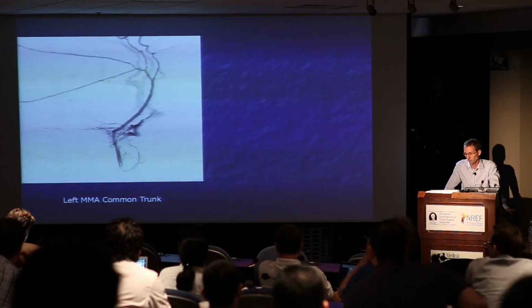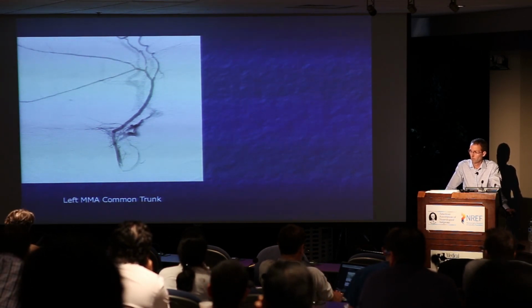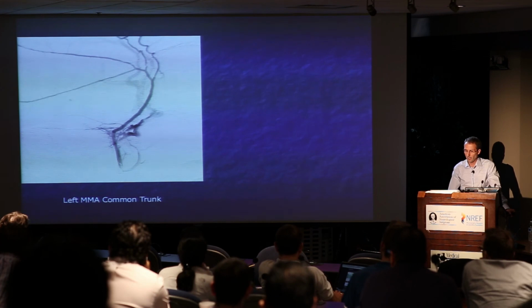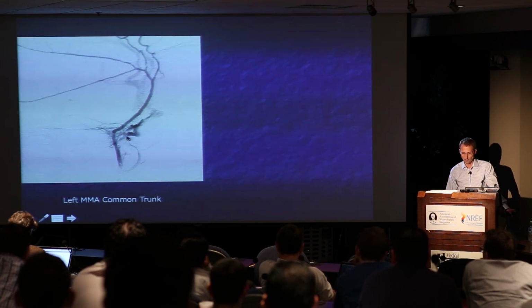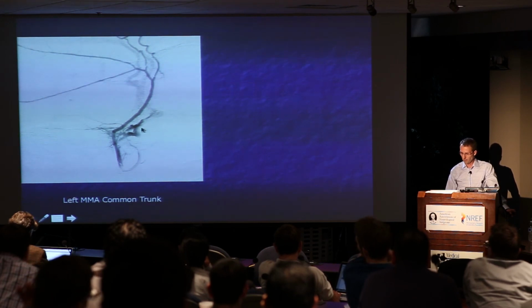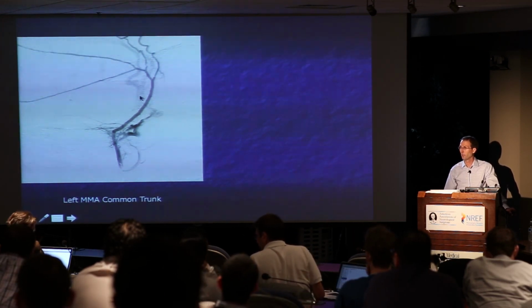But you can show them that. Just on that picture, one of the things you can ask yourself when you're analyzing this is what on that picture is artery, what is vein, and then start to narrow it down between those two routes into where the fistula is. Absolutely. So this obviously is the main trunk entering the foramen spinosum running forward, but there are tiny little branches coming off here, and then there's a caliber change right about in this location, where this is switching to the venous pouch. So the fistula has to be located more in here, and this more is that venous pouch in the sphenoid, ultimately running with the outflow to these cortical veins. I agree with that analysis 100%.